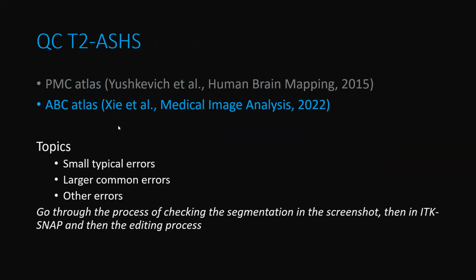So then I want to go to the ABC atlas. I will cover kind of the same topics, and actually the larger errors, the larger common errors are the same. Actually, the small typical errors are also the same. And the process of checking the screenshots, ITK snap, the editing process is all the same. So I won't spend too much time on that.